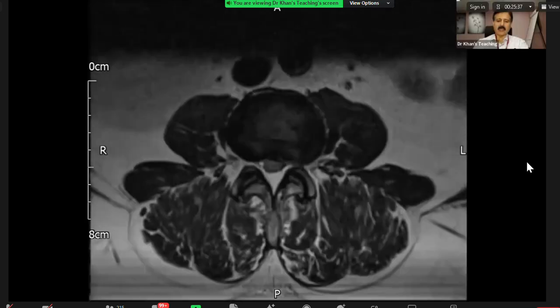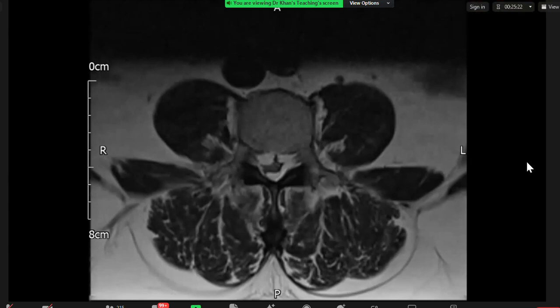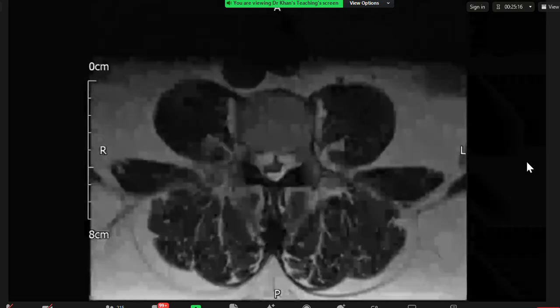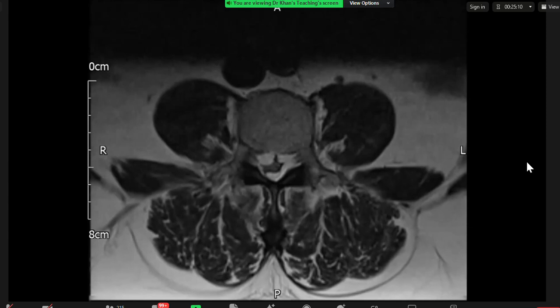Okay, let's have a discussion. I'll take over the mouse. Now you have seen everything. What do you think is happening? Why is this thecal sac compressed? They've got an adrenal lesion on CT, and then they've got clumping. So the roots are all clumped together and then being pulled anteriorly. I'm concerned that there's like an arachnoiditis or just deposits that are causing that pathology.